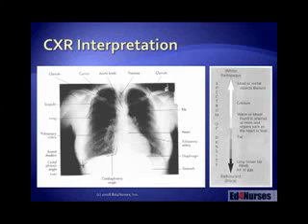Some of the other things identified on this X-ray are the heart, and that's another thing to assess, because a lot of times you'll see a big heart, which can tell you your patient may have heart failure. Also be looking at the abdomen, and you may see some things happening in the abdomen as well. These could be clues that you've got something going on here. Okay, now let's get into the actual interpretation using a 5-step method and look at some X-rays, and hopefully you pick up some pointers that you can use the next time you encounter a chest X-ray on your patient.